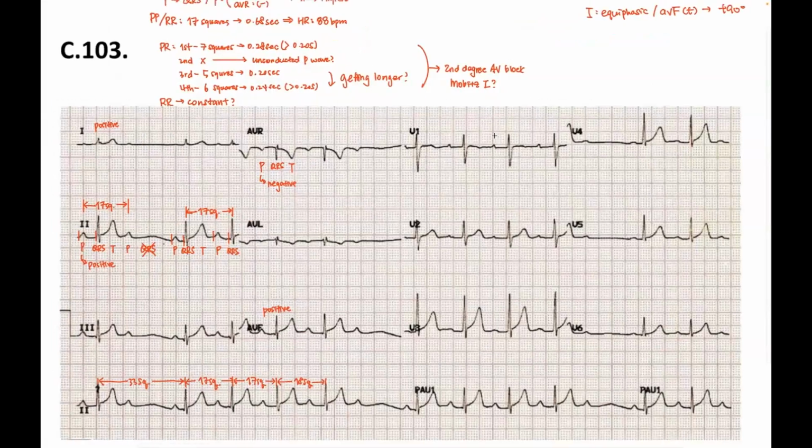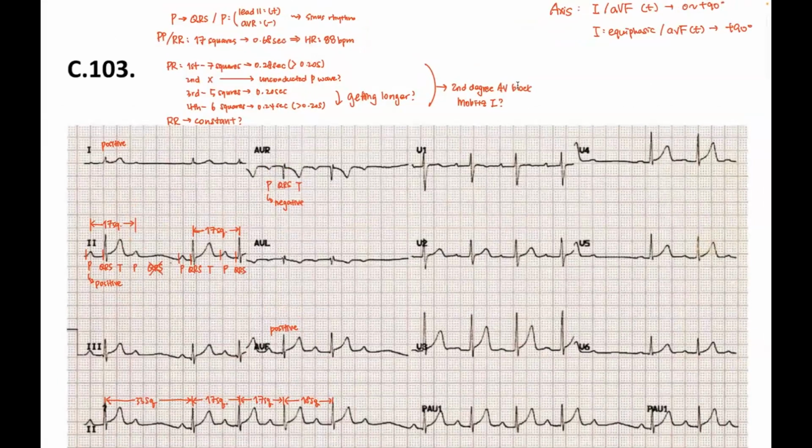Now tell me your story. That's a very nicely prepared ECG. First, if I check the rhythm, QRS is preceded by P wave, and P wave is positive in lead 2 and negative in aVR, so it is sinus rhythm. If I check the RR interval, it is about 3.5 big squares, so the heart rate is about 85 BPM, which is lower.